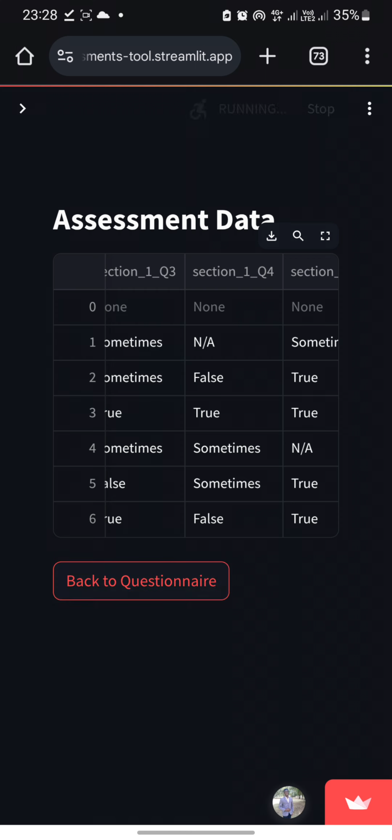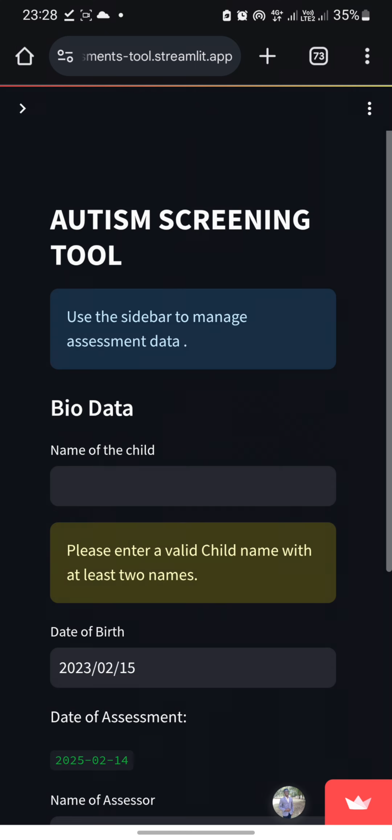So this is just a tool that currently manages the process of autism assessments, and as you can see, it's portable. I'm doing it from the comfort of my phone, unlike doing it manually with papers, which are resource intensive. So this is why I believe this tool is very important, and we are looking forward to scaling it to include doctors and other stakeholders, parents. They can also give inputs here, and also to include generative AI capabilities that will give educational content about autism.